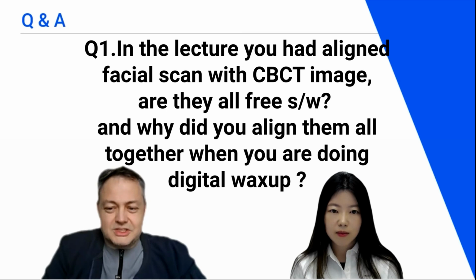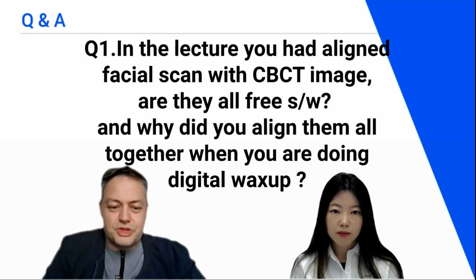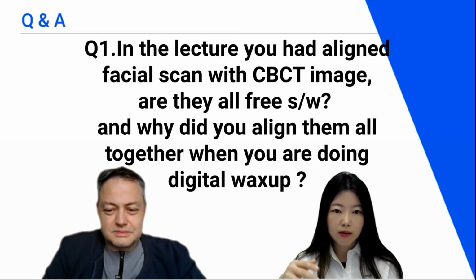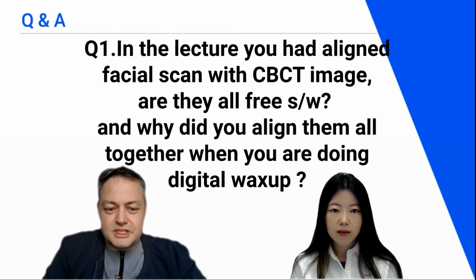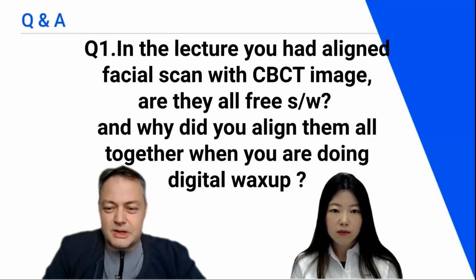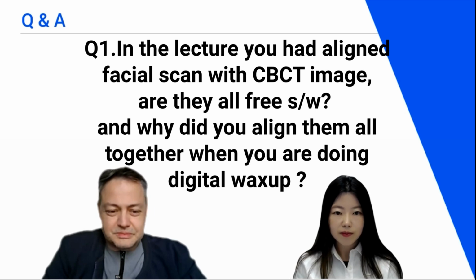So this is helpful. Then with the roots, you also can go with an orthodontics case, and to know how to displace the teeth, to put them in a proper position, to then do the planning and continue with the prosthetic phase. But in your lecture, the case was just for the full mouth rehabilitation, or ortho, or what was it about? No, ortho was not planned in this case, but merging the actual crowns with the roots is very helpful for orthodontists as well. So it's a technique that you can use on any case you need when it goes to ortho, for example, for aligners. Okay.